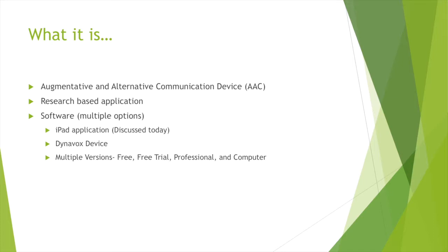There's a free version, which is limited in what it has to offer, limited screens, limited vocabularies, limited edits, and so on. It offers a free 30-day trial, which is one of the best perks I can say about this application. Most communication devices or communication applications don't offer a free trial for 30 days. So in the event you're working with an individual, doing an assessment, trying to figure out the best communication needs, oftentimes you want to trial multiple devices. The Dynavox Compass application offers this, whereas other applications don't always.